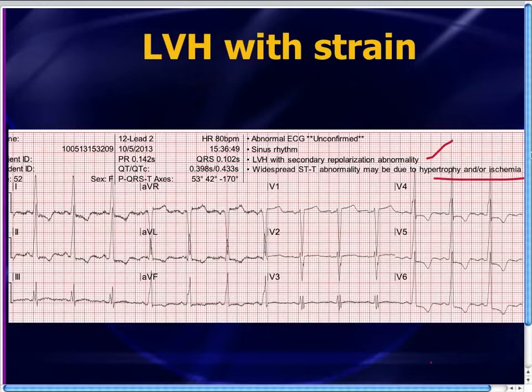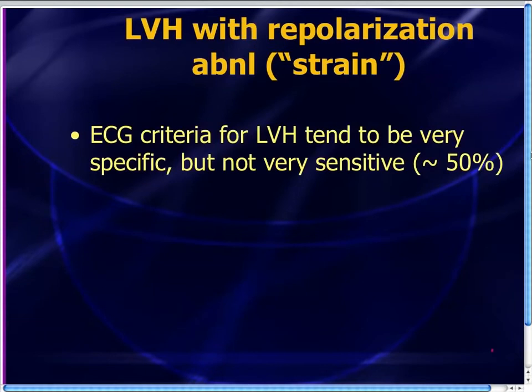So let's talk about left ventricular hypertrophy. Let me preface this by saying, although I love electrocardiography, I hate LVH. I absolutely hate LVH. If LVH were a baby, this is a baby that even his mama would hate. I don't think anybody likes LVH because the EKG criteria are so difficult. First of all, the EKG is not even all that sensitive for picking up LVH. It's only about 50% sensitive. It's pretty specific, but the sensitivity for the EKG or ECG to pick up LVH is not all that good. The real diagnosis is based on echo or cath.